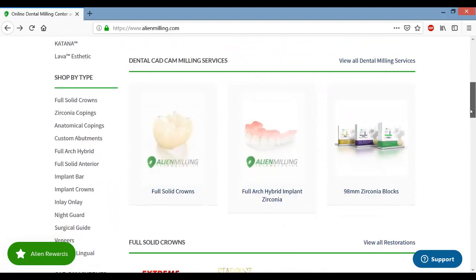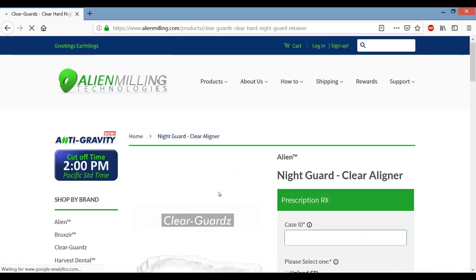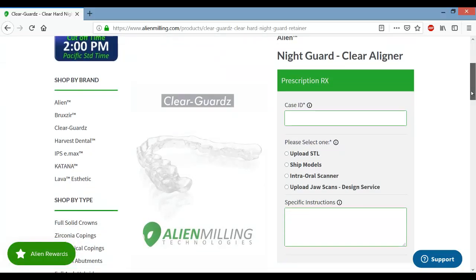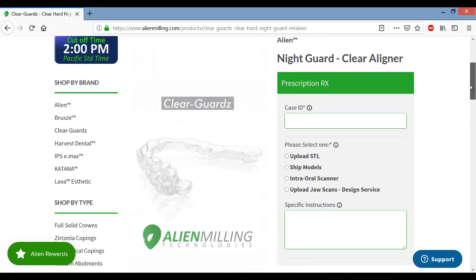One I'm kind of interested in is you can start off cheap to see how everything's going to fit. And this is all going to be up to you, because I think ZBrush has got a 3D printing option to fit the size to the real world size units. I haven't tried none of this, but you could try this. You can see it says upload your files. So this is going to be something totally up to you.